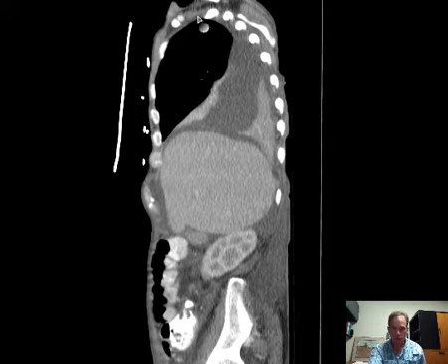But here, the right upper lobe has been compressed and deflated a little bit here superiorly, and because the right middle lobe has fallen away from its position, which is usually like a triangle here, and has flattened out, that has allowed the right upper lobe to expand more fully down into that region.